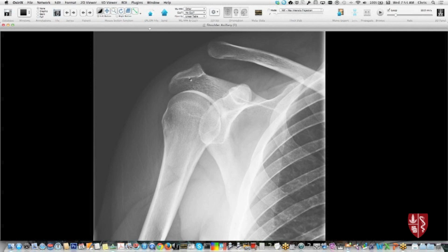between the clavicle and the acromion. And the thing to remember is that when you go from just injury to the AC joint capsule itself to one where it's that capsule plus the coracoclavicular ligaments, if these are injured, then that becomes a grade 3 injury. And so in this case, this is widened, definitely more than 12 millimeters, and that means that there's disruption of the coracoclavicular ligaments, making it at least a grade 3 injury, and sometimes that's what heads patients towards this being surgical, or at least makes it longer expected healing of the injury.